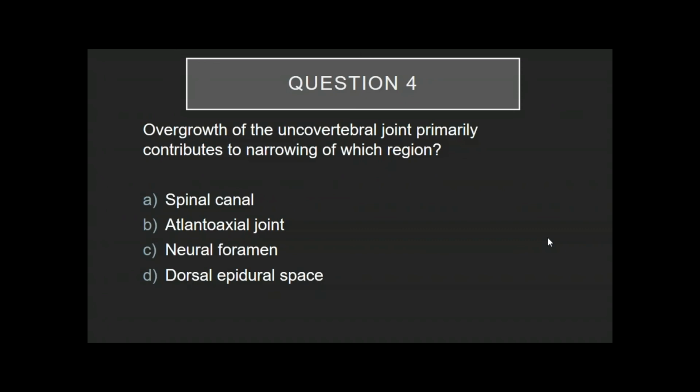So the only reason we're going to move on to MRI is once we've seen on CT in a trauma setting that there is traumatic injury. There are some traumatic injuries that don't need an MRI. I didn't show you all the little small things. If you have a spinous process fracture or a transverse process fracture or something like that, that does not need an MRI. It's only when you start seeing, hey, this is impinging on the canal, it's potentially smushing the cord, there may be an epidural hematoma, that's when you're going to get an MRI.